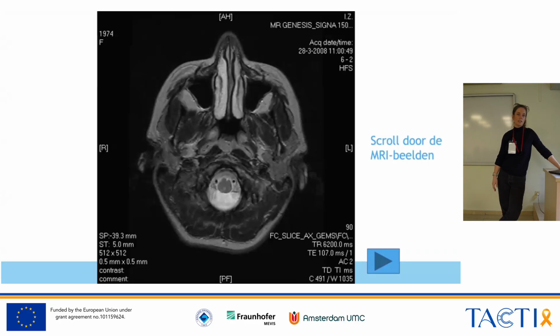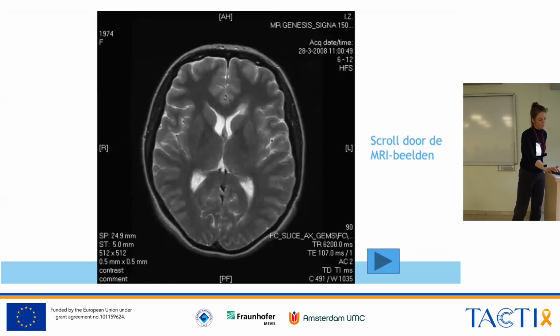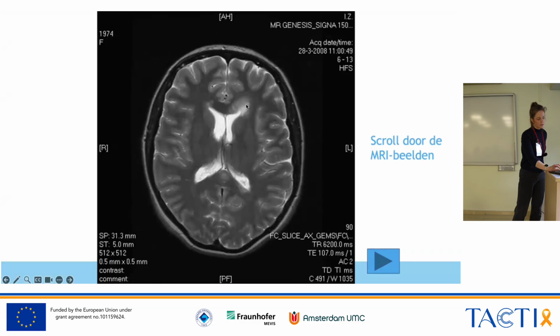So in that sense, it's not monophasic, and the contrast scan really helps in this case. There are some signs here that there is acute inflammation going on as well, because if you look at this lesion, it is quite big. You could say it's a bit swollen, and you see edema around it. So not good. This is the border here, right? The border of the lesion, and this is more vague. So this is, I think, edema.